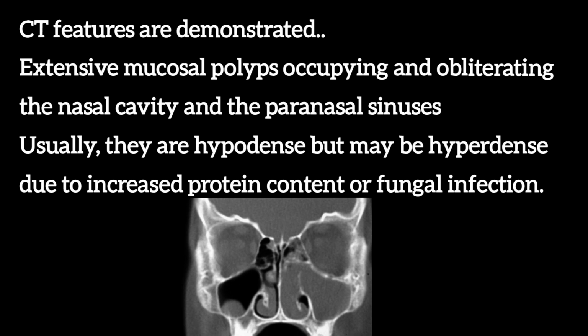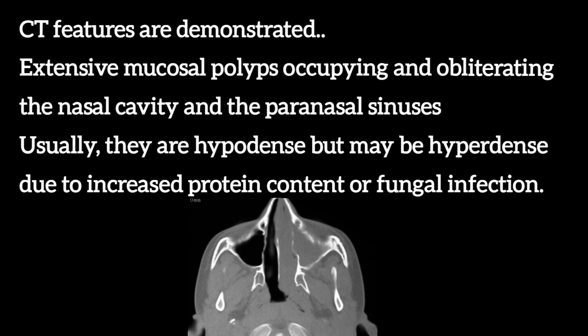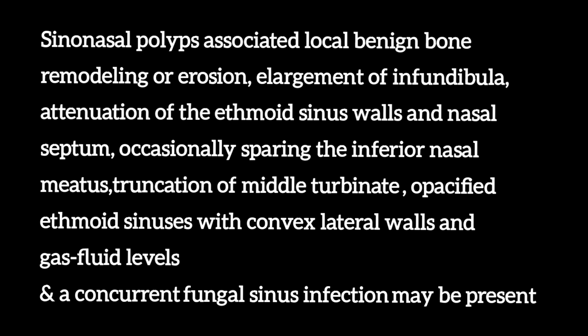CT features are demonstrated. Extensive mucosal polyps occupying and obliterating the nasal cavity and the paranasal sinuses. Usually, they are hypodense but may be hyperdense due to increased protein content or fungal infection.